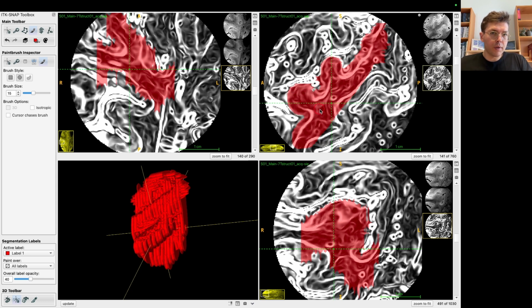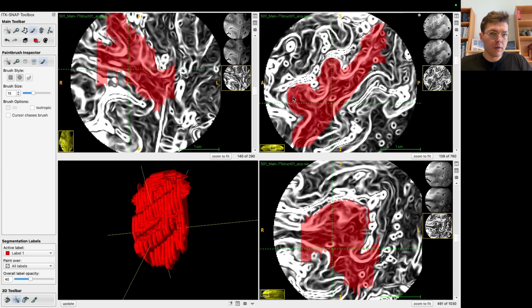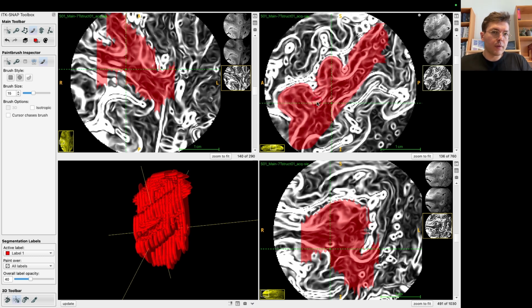And since luckily we have a small region of interest, we can just do this maybe a bit more manually and without worrying about making it fully automatic and so forth. But we will at least know that it fits to our data exactly, this main data, right?